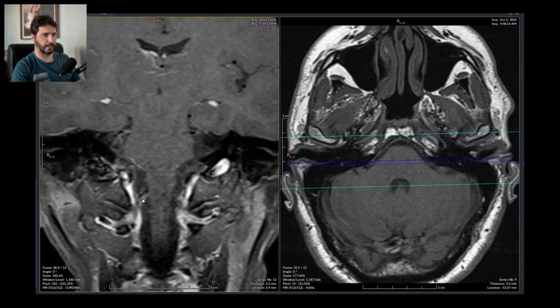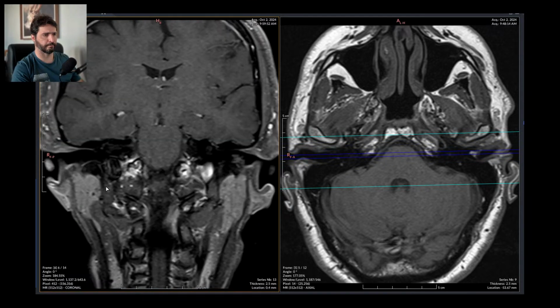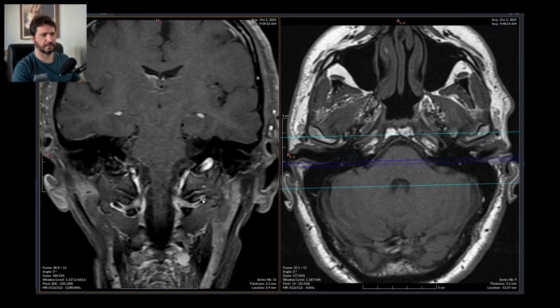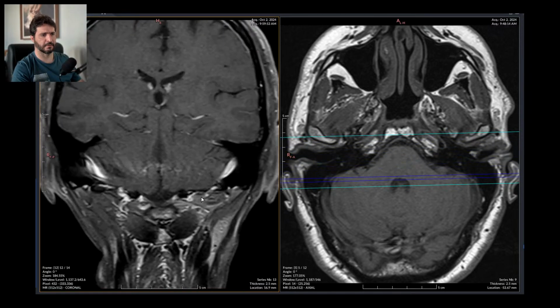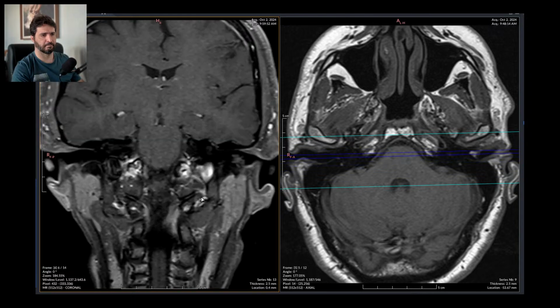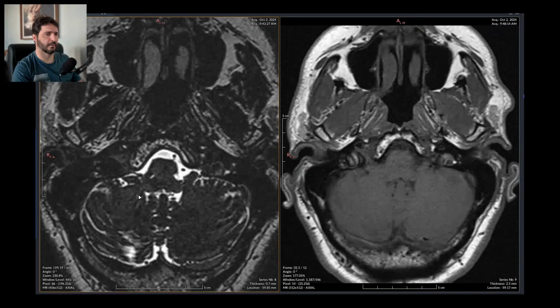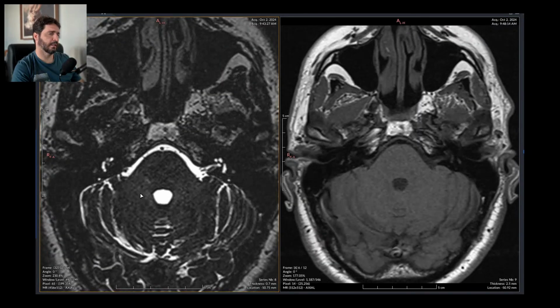They also did a coronal post-contrast phase, which makes no sense, just to waste more time. And we have a normal scan, just as in past December.